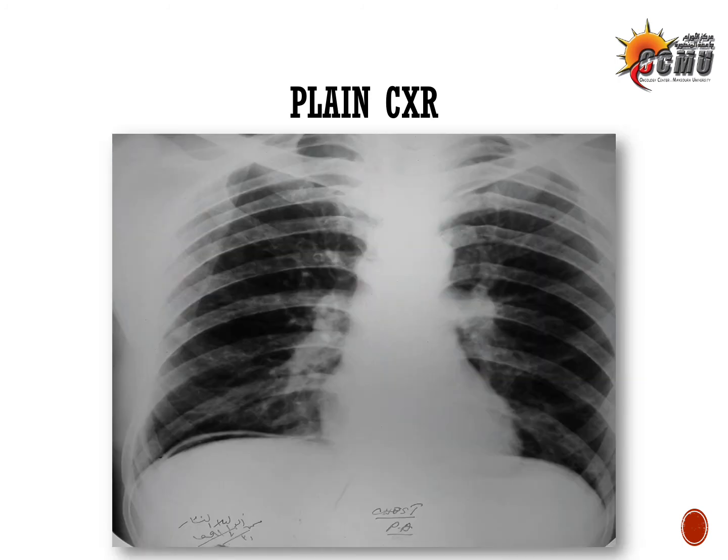Sometimes you may encounter such a film. This is a plain chest X-ray with the heart shadow in the middle, so to the left. On the left there is minimal air seen, but on the right there are actually some gaseous shadows. So this is pneumoperitoneum, air under diaphragm denotes pneumoperitoneum.